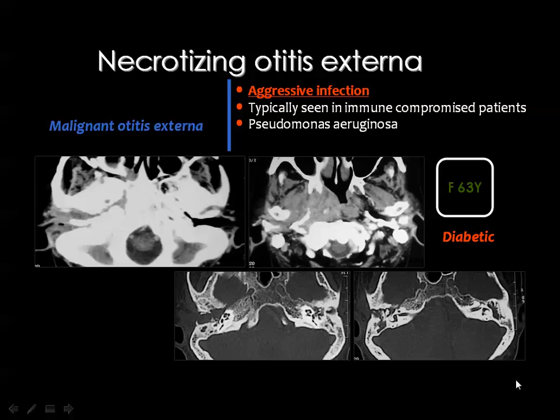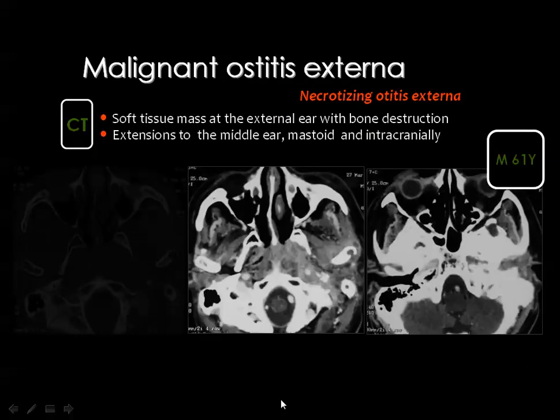On the left side, you can see that the middle ear cavity is obliterated by soft tissue density. The ossicles are more or less intact, and this is just otitis media.